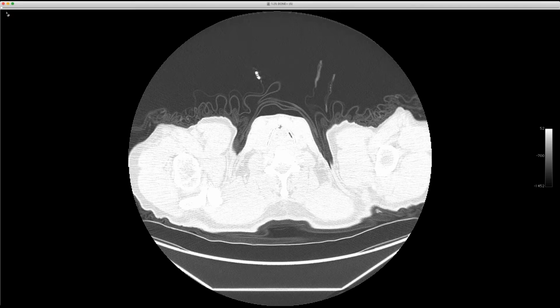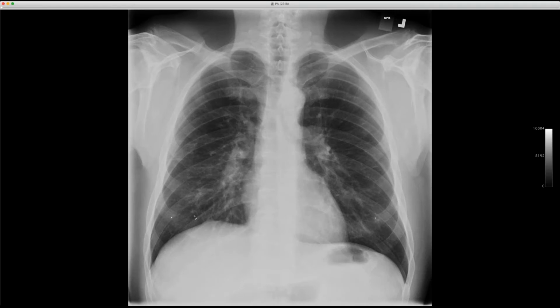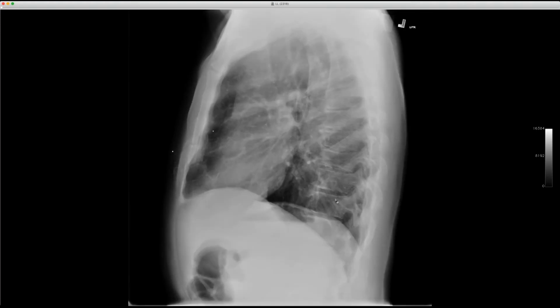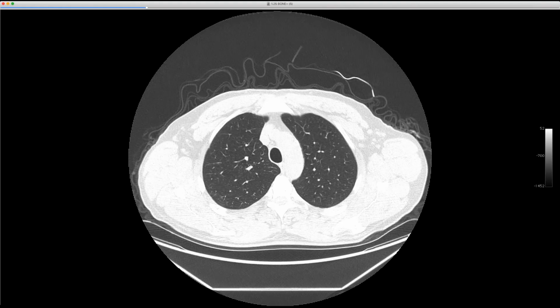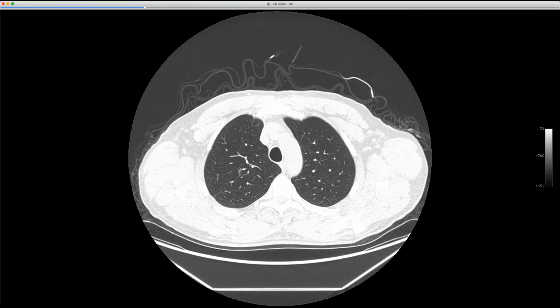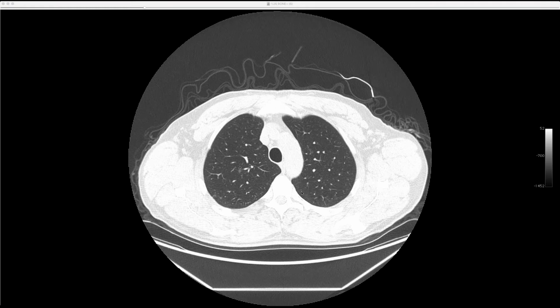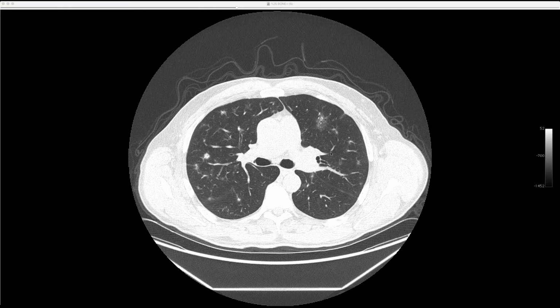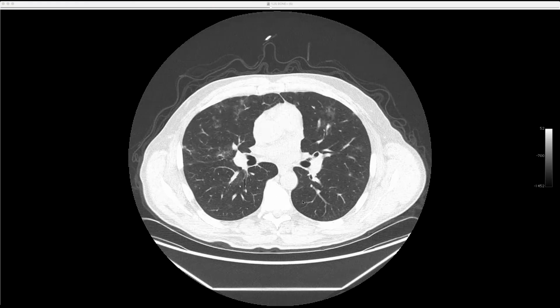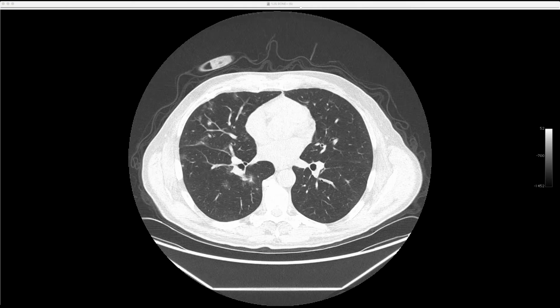So this is a young man who has a history of ulcerative colitis, and he came in at this time with a cough. You can see he's got these subtle opacities, not quite nodules, in the lower lobes, not all that exciting looking on the chest radiograph, but it wasn't quite normal. They did a CT a few days later, and he's got these peribronchial foci of ground glass, and nodules with little halos around them. But they're very airway centric. As we go further down, they become a little easier to see, patchy ground glass.